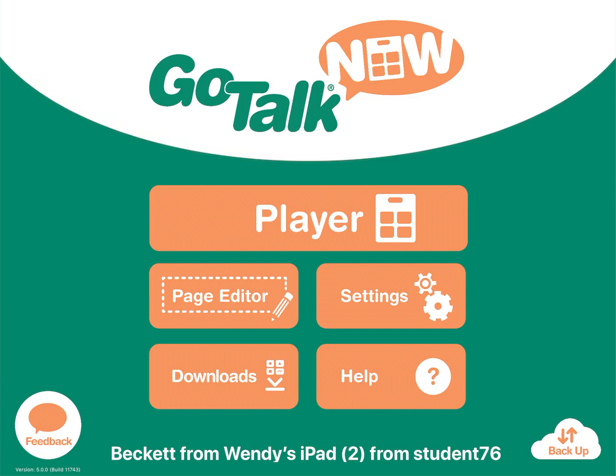Going to be looking at the GoTalk app that is for the iPad. As you can see, we are on the main page. At the top is Player. Player is the button you would push for the app to activate and the student to use.